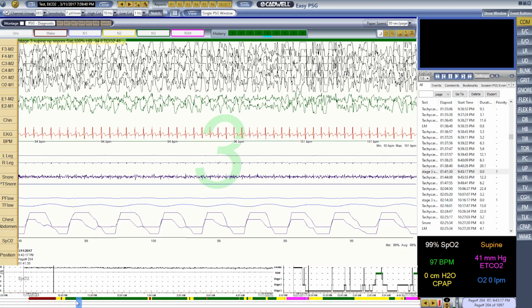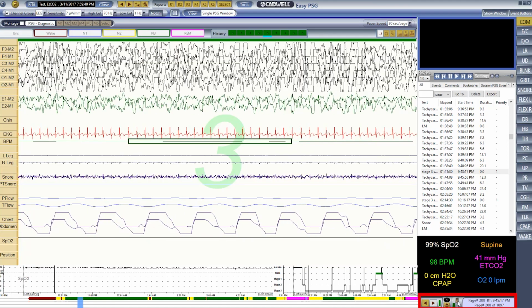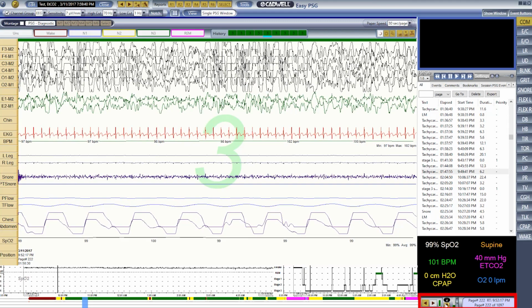position bar. Auto scroll is also available, allowing you to start or stop the scrolling process, adjust how fast to scroll through the record, or even allowing you to skip pages while scrolling.